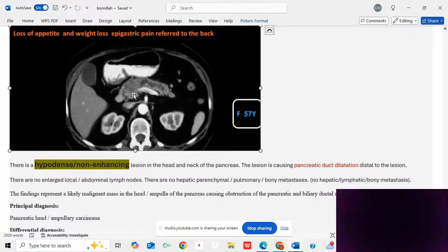Okay, so the good news is that pancreatic cancer can be biopsied by endoscopic ultrasound. You can go through his mouth, through the stomach and then the duodenum, because the pancreas is closely related to the duodenum, as you know.